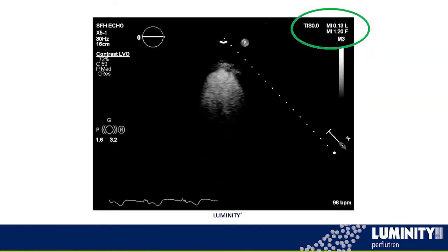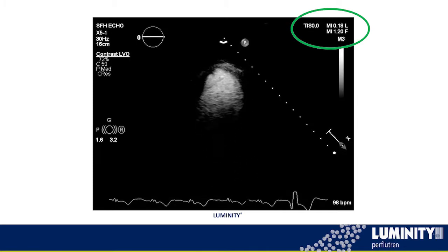It's really about how far the sound wave has to travel. And if you imagine a bubble that's 5 centimeters away and you hit it at an MI level of 0.3, it expands and contracts the bubbles nicely. Now, if you have to travel with that same power, another 10 centimeters, in this example, the base of the heart, it's barely going to resonate that bubble, right?